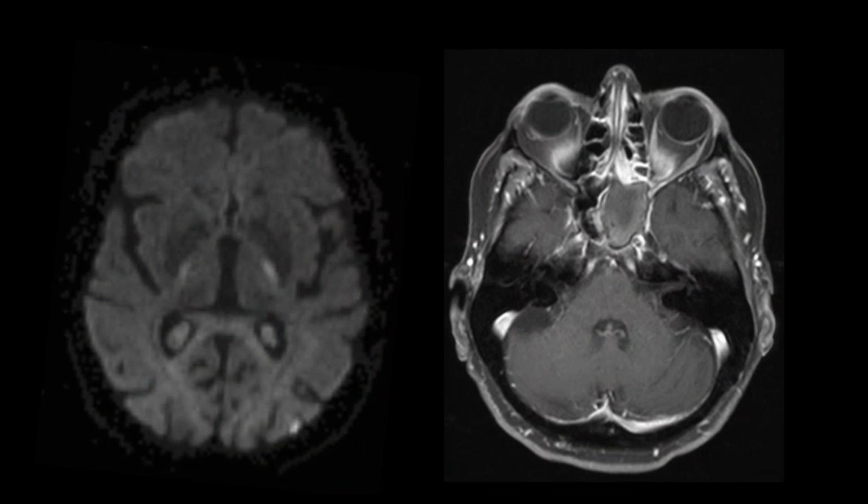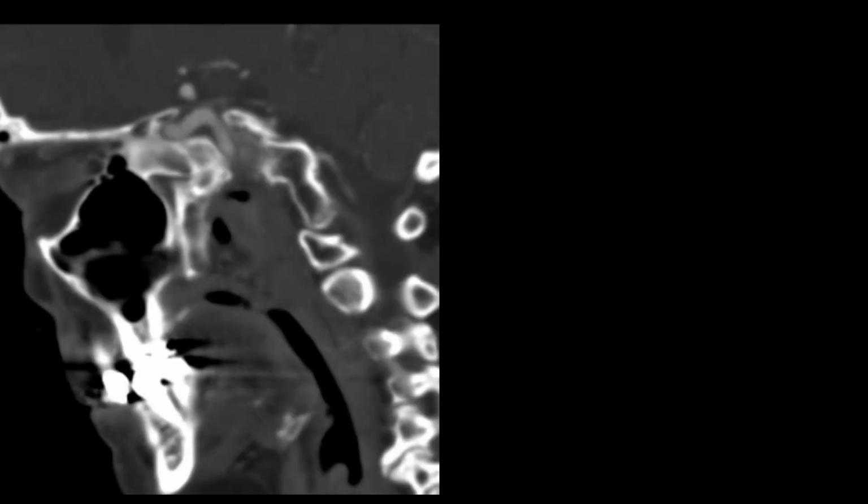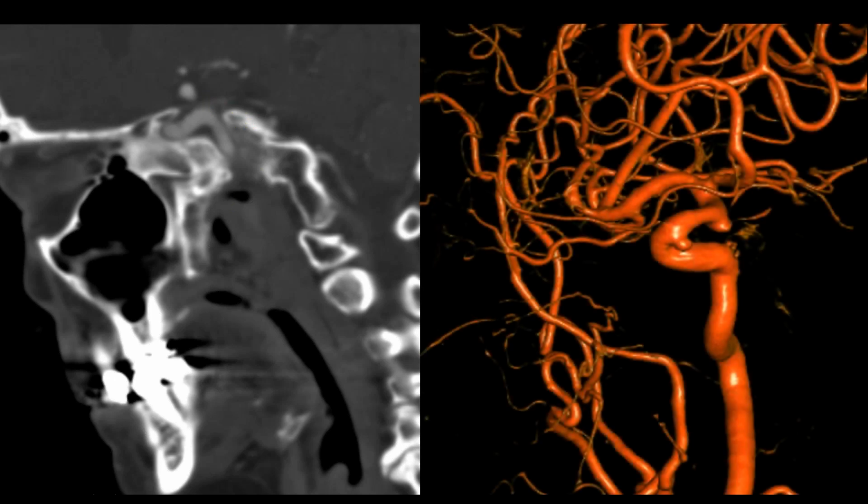Here's another unfortunate patient. This is a patient who came in with a known metastasis, and they thought the patient might have a very small area of ischemia posteriorly on their MRI we see here on this diffusion sequence. So they decided to work this up and look at the blood vessels on the patient. So the patient had a CTA examination, and they thought that there might be a little aneurysm coming off of the cavernous segment. So they did some fancy 3D reconstructions of the CTA study, and they said, yes, it looks like we have a cavernous segment carotid aneurysm that's coming off.